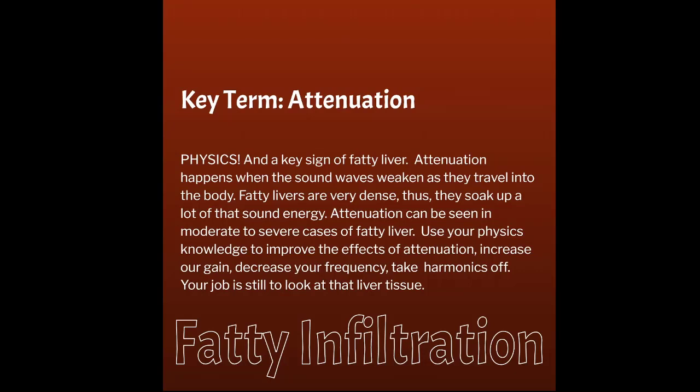As that sound beam weakens, it cannot send back nearly as strong of echoes, and so what we find is that our picture gets darker or weaker as the depth increases in the picture. And so in the case of the fatty liver, we end up having a very fatty liver, very dense, absorbs a lot of that ultrasound energy, and then we find that that far field gets a lot darker because we just don't have as much sound energy getting to that area.